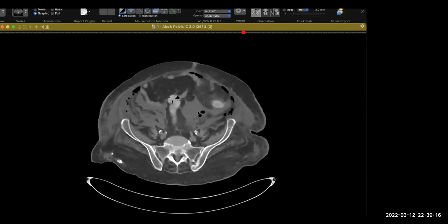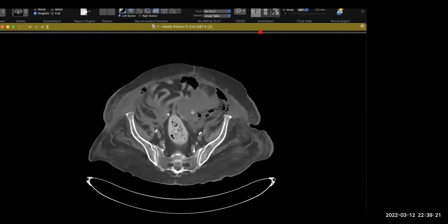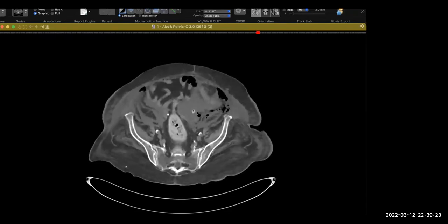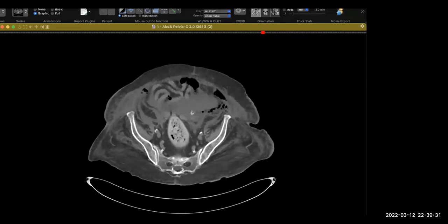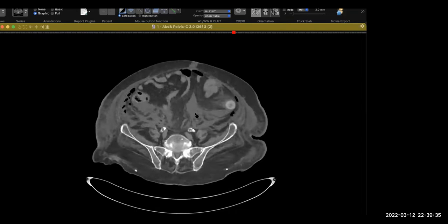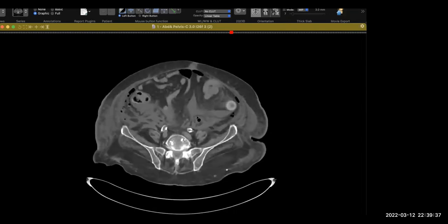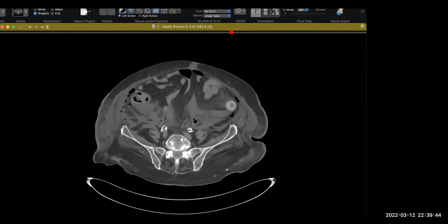So I'm just thinking if there is a rupture of the bladder wall, a traumatic or iatrogenic rupture, and then there is air and the surrounding fluid, because the position of the urinary catheter is not in the pelvis, it's very high up. So I'm not happy with that.